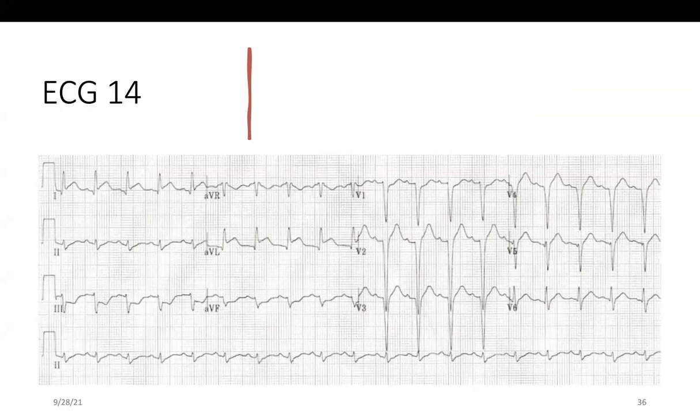I think there is ST elevation from lead 1, and ST depression in lead 3 and AVF, ST elevation in AVL, and QS pattern from V1 to V4. So I think it's high lateral MI. Exactly.